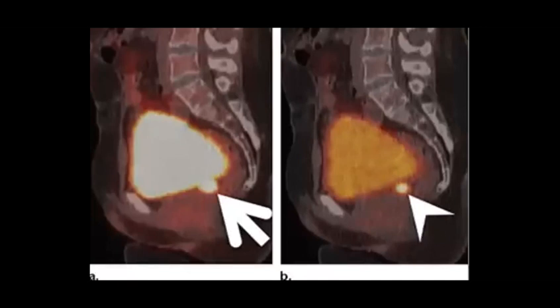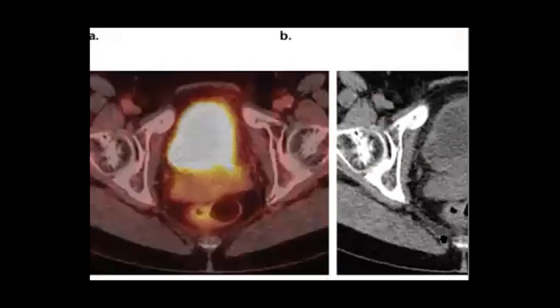Perfect. So sometimes urinary excretion can hide, and you can mention that it is easier to call it a diverticulum, but sometimes it's not.